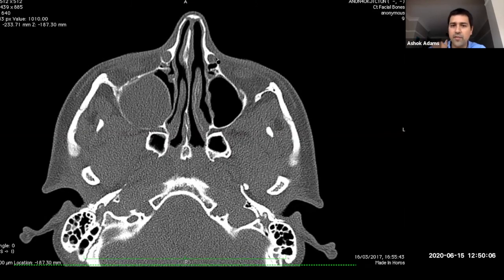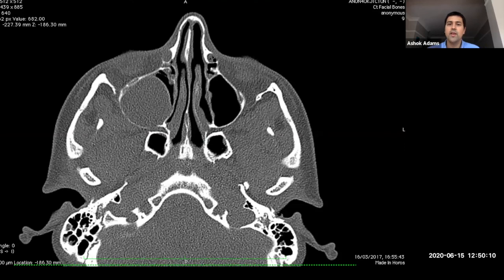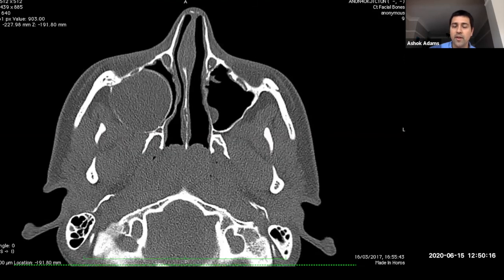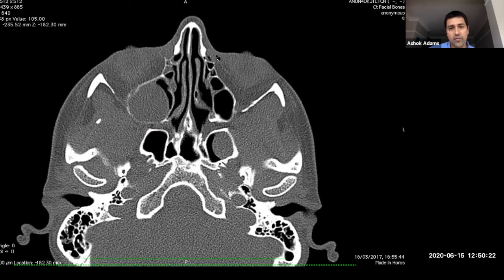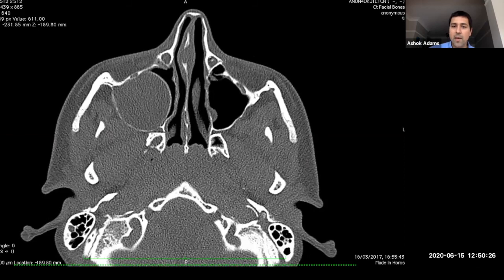I've seen a few cases of infections which destroyed the bone. The other thing is if it becomes remodeled or destroyed, you often will see that either with a sinonasal tumour that's spread up the nasolacrimal duct, or vice versa, you've got an orbital or skin cancer or tumour over the top that's gone into the nasolacrimal duct. So it can be a pattern of spread of tumour. This is what we'll often see.